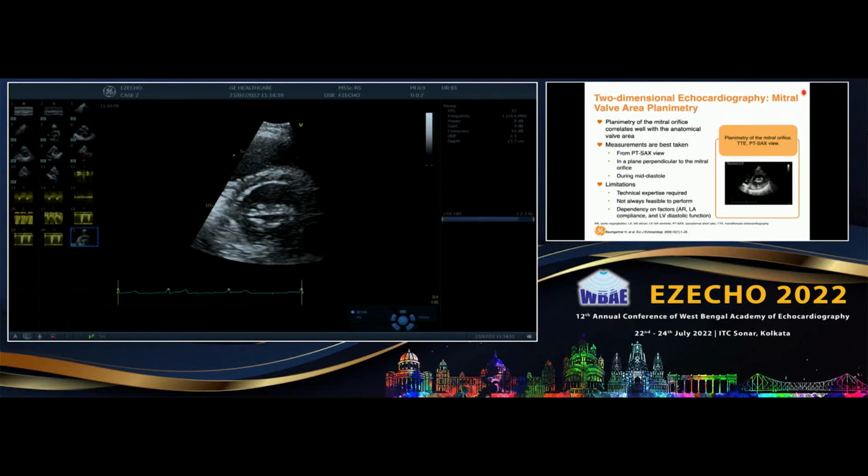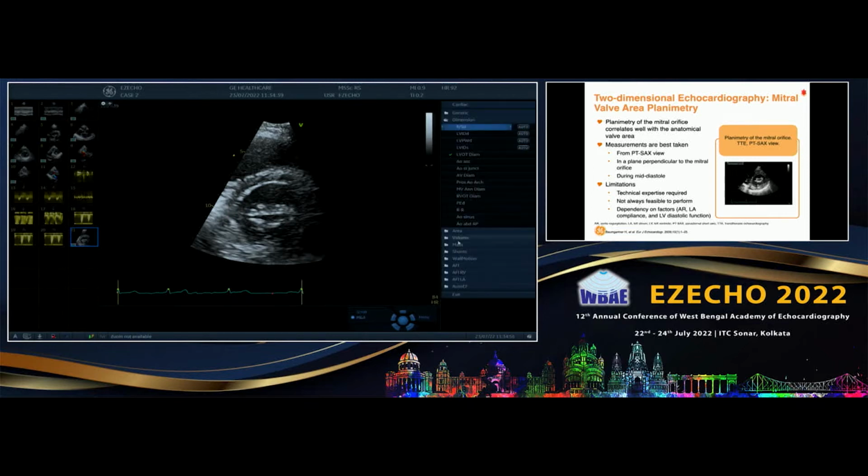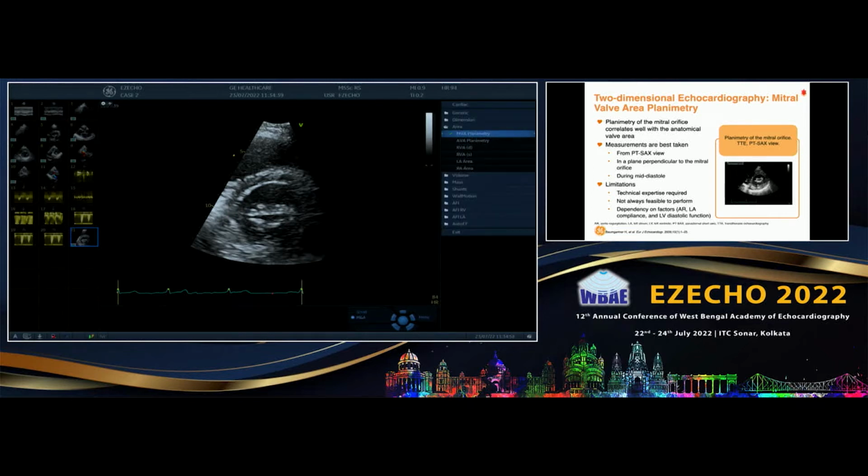We know that this commissure is partially open. Sometimes the calcium can create a horizontal signal. See this calcium. Do you think that it is really horizontal like this? That is what it looks like, but do you think this calcium is pressed and made like a slab? Is it like that? No.